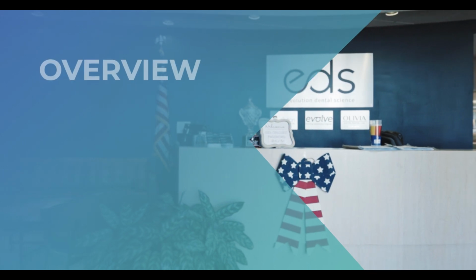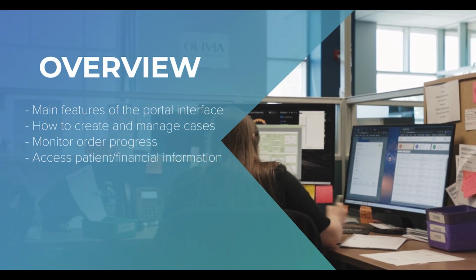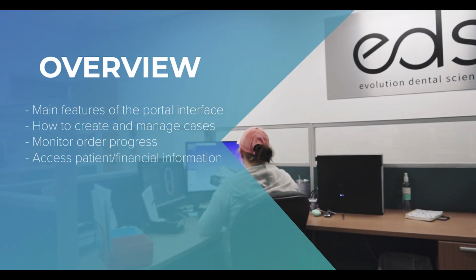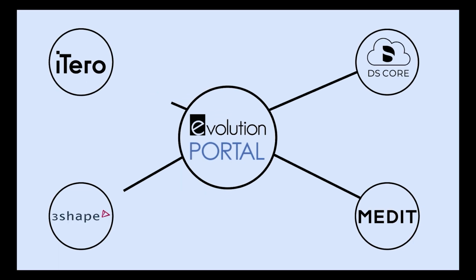In this video, we will walk through the main features of the portal interface, including how to create and manage cases efficiently, monitor order progress, and access patient and financial information. Evolution Portal directly integrates with all major intraoral scanning brands, allowing for instant file transfer and lab production.